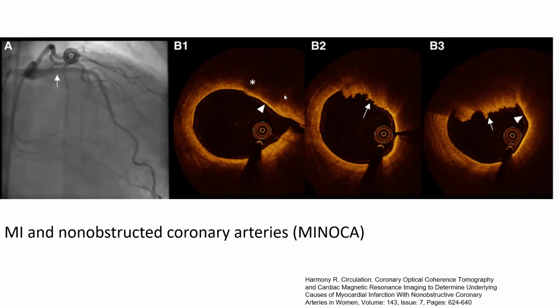So one, you see heavy lipid core. Okay. This again, dark, low intensity, loose edges. So heavy lipid core here. Then you see here afterward, this is a plaque rupture with thrombus formation. Look at the cap, it's a thin cap that all of a sudden is broken, and you get thrombus formation. And actually, you probably get a bulging of some of that lipid with pieces of thrombus on top of it.